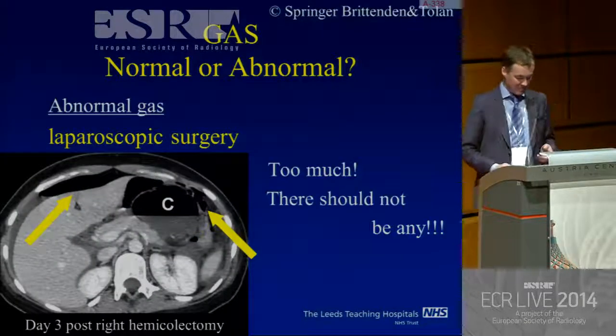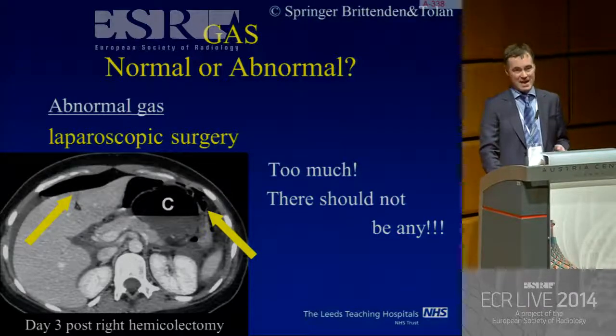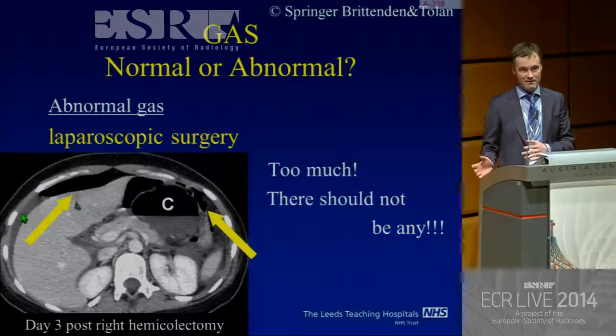So here's an example, a patient day 3 after a right hemicolectomy. There should not be any gas. There is far too much gas in this abdomen. There's also some fluid. I'm worried that there is a leak.